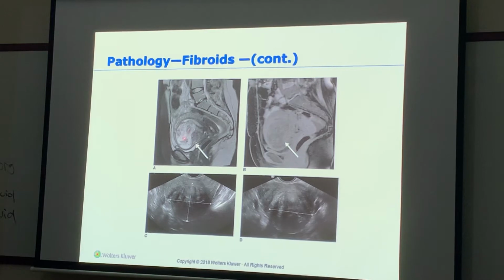What is this one? T2? T1. See the difference on how it looks. Okay? And as an MRI technologist, I will do that. I'll be taught to use T1 and T2 because I'm going to do everything in my power for the doctor to make a diagnosis. Why? They might want to embolize this. What does it mean when I say they want to embolize it?